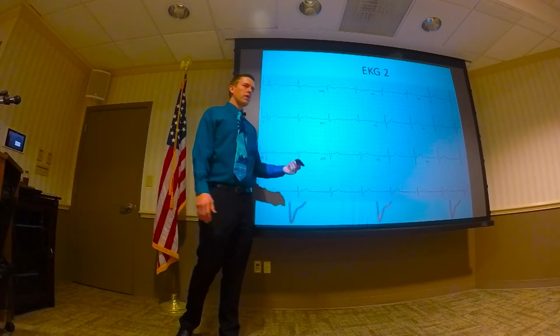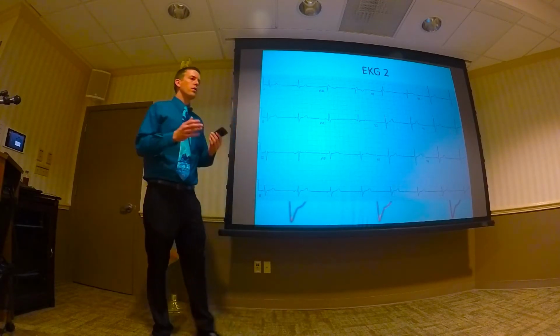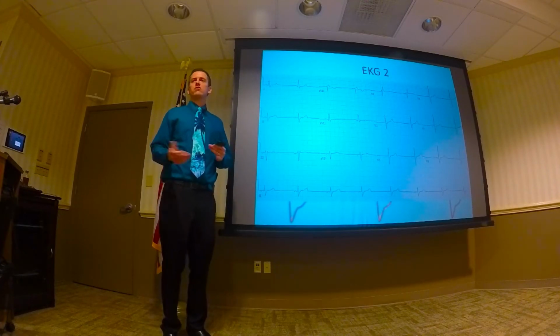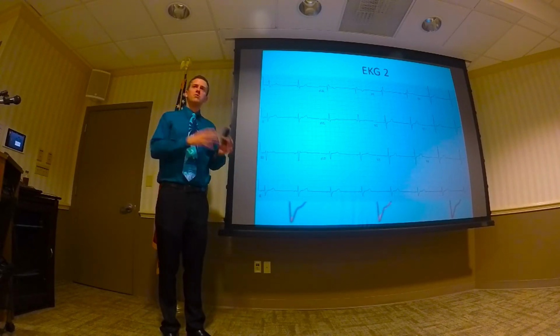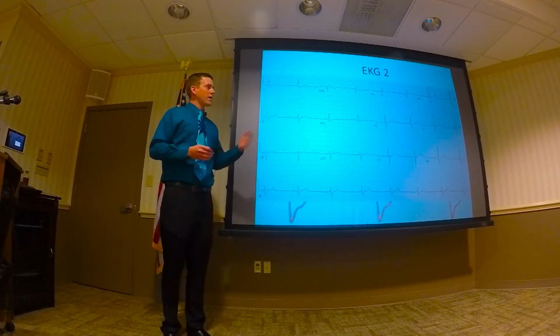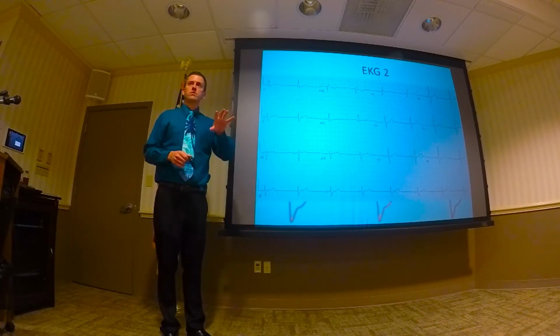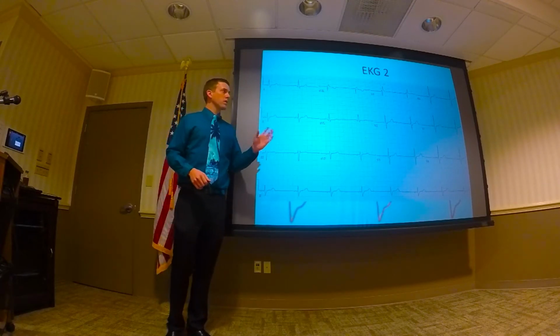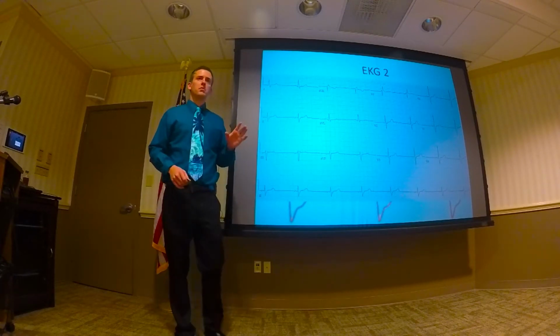Usually it's going to be bradycardic. If the sinus node doesn't fire for some reason, such as sinus node dysfunction or medication that keeps the sinus node from firing, the backup to that would be an atrial pacemaker. The sinus node rate is about 60 to 100. A backup atrial pacemaker will probably be around 60, but maybe a little bit less.